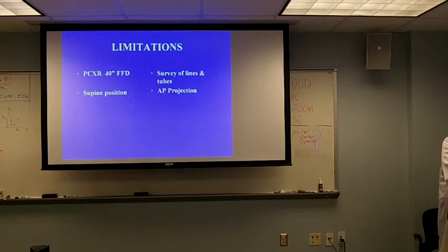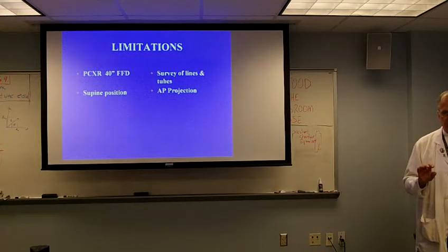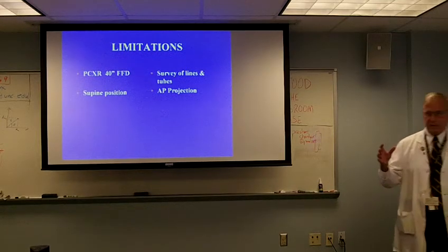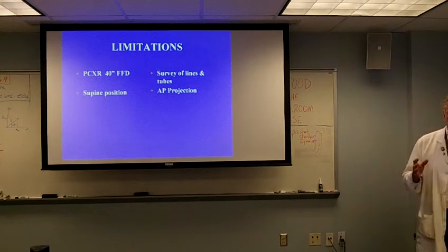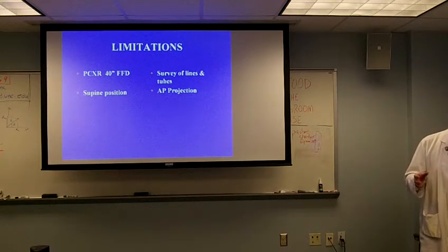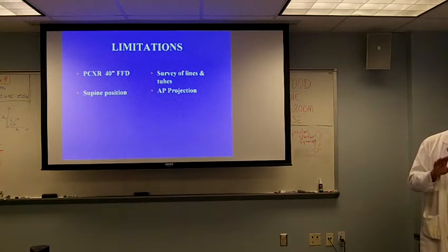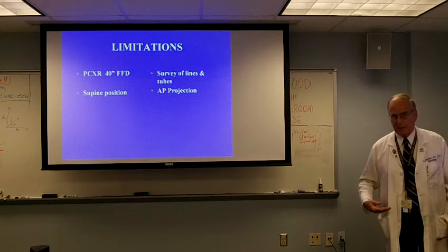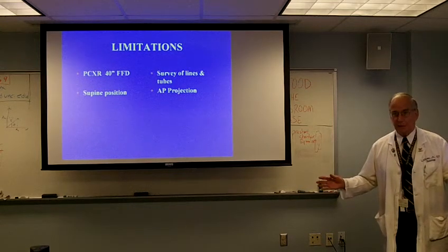Limitations of bedside radiography. As you all know, and this is a big learning problem for house staff and for other physicians who are used to seeing upright PA chests, things are different when they're done at the bedside. You've got a 40-inch FFD, if that, maybe even closer. It's an AP projection. I don't know about your patient population, but in our patient population, most of the patients are really, really big. And since you don't have gravity helping you to move the diaphragm down, the diaphragm has to move all those chitlins out of the way by itself, and it doesn't do a very good job.